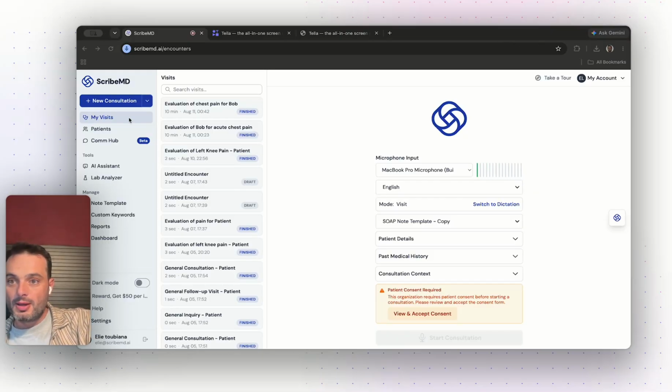All right, so the way you get started, I'm going to show you everything on the computer. Keep in mind that you can essentially do the exact same thing on your phone, and there's going to be another video dedicated to how to do it on your phone. Right now, I'm going to show it on the computer.